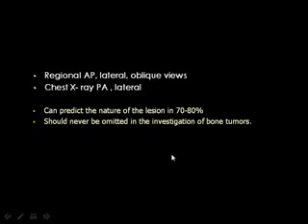Actually, the plain X-ray is very important in assessment of bone tumors because it provides most of the necessary information to predict the possibility of the tumor. And this is a very important statement: the X-ray should never be omitted in the investigation of bone tumors.